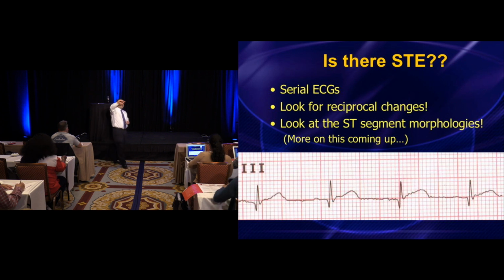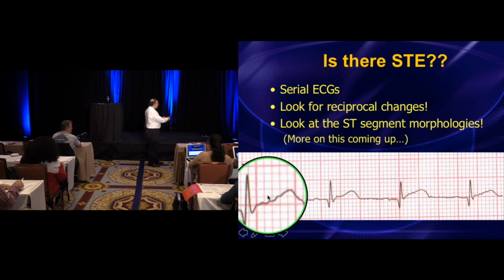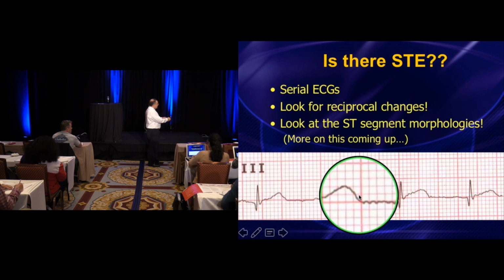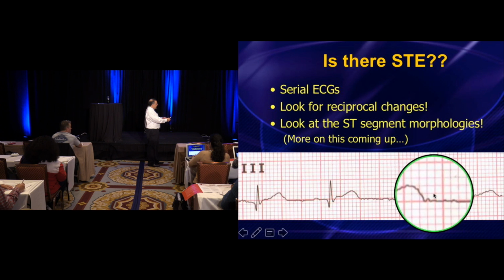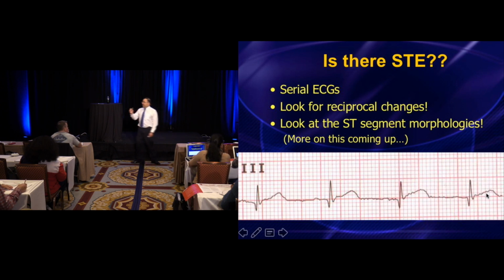But when it's straight, your computer will miss that, and oftentimes the physicians will miss that as well, but you can't afford to. All right? The initial part of the ST segment should never be straight. If you look at this impulse right there, that's nice and concave upwards. You see how it's like a cup holding water, slightly concave upwards. But this impulse right there is too straight, and that's a bit too straight as well. So when you see impulses that look like that, you've got to worry that you're looking at cardiac ischemia.